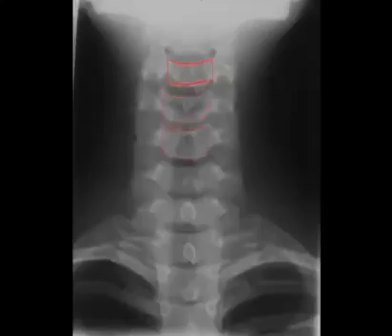Now, what can be difficult in this projection is to identify what segment you are visualizing. One trick of the trade is to come down to the first thoracic segment, which is typically characterized by articulating with the first rib that you see here very well. Now, the problem with just using the first rib is that sometimes patients have anomalies, such as cervical ribs, in which case they may have a rib actually extending from C7 most commonly.